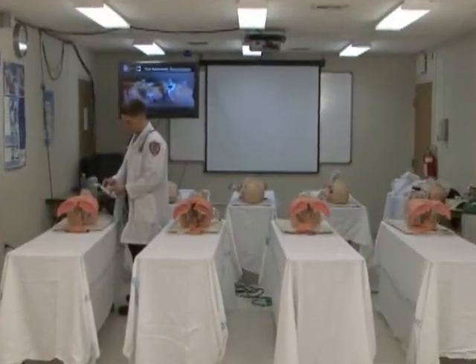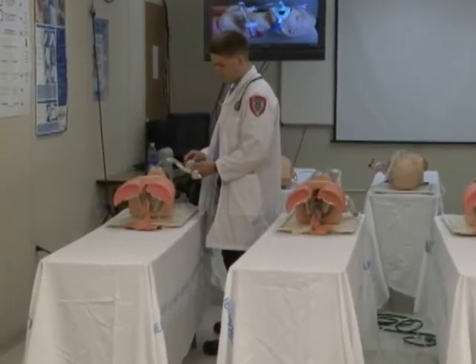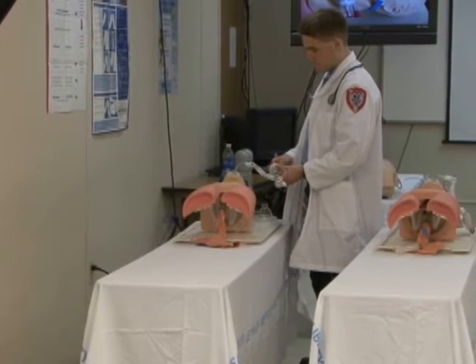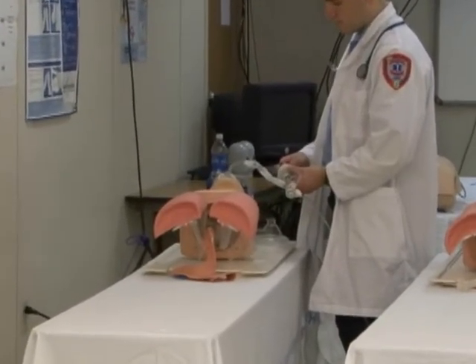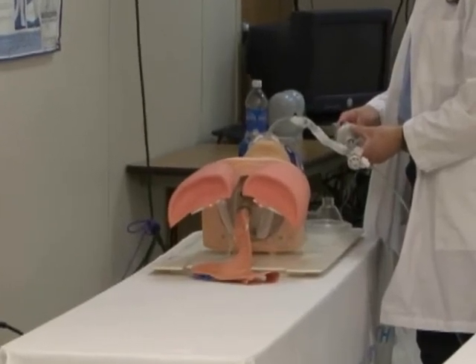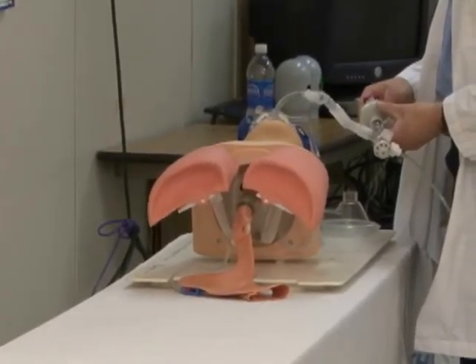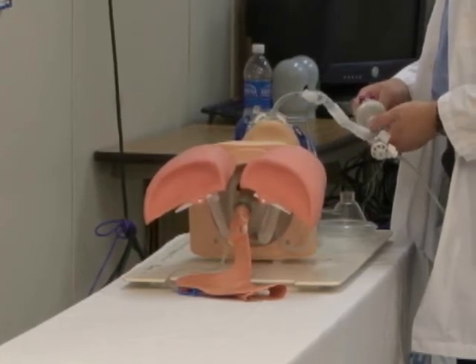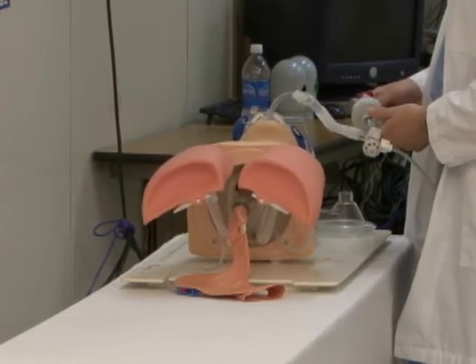If the patient's airway path from the resuscitator becomes occluded during normal operation, the device will start to cycle rapidly. Clear the pathway so that the patient will receive effective ventilation. Because the resuscitator is pressure cycled, changes in the patient's lung compliance will cause a change in the patient's breathing rate. In such an event, make the appropriate clinical changes. Significant leaks within the circuit will cause the rate to slow down or stop.